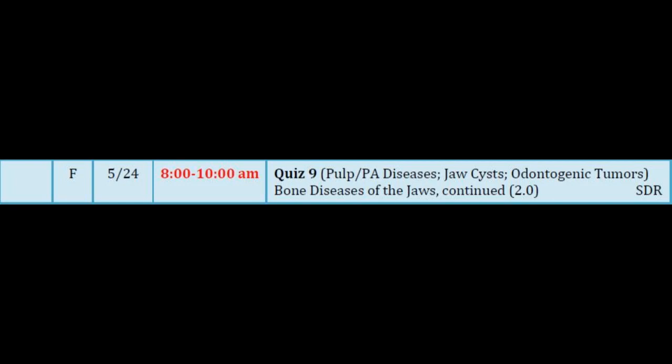How would you distinguish it from odontogenic myxoma? Odontogenic myxoma has really small loculations and very delicate residual bone forming the trabeculae. Very, very delicate. It can look quite similar to this. Odontogenic myxoma is more common, so I would always put it higher on my differential. And the others, there are usually other clues, location or age or something like that. So you can prioritize them, but you might have them all on your differential.